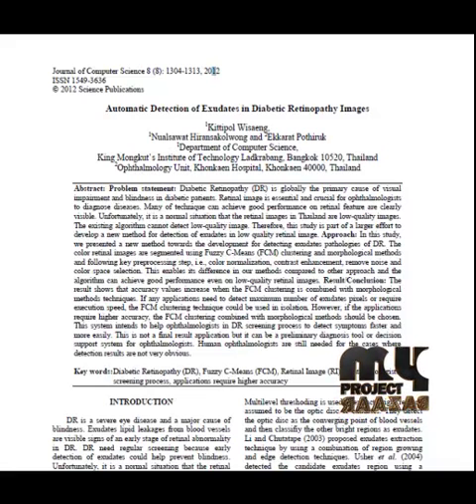Let me discuss the process of automatic detection of exudates in diabetic retinopathy images. Initially, the retinal color channels from the retinal images were separated. Filtering is done; we are using a Gaussian filter to filter the images. Then the images were enhanced using histogram equalization and normalization operations. Then for normal images, the optic disc is segmented, and for the other images we are segmenting the defected regions.